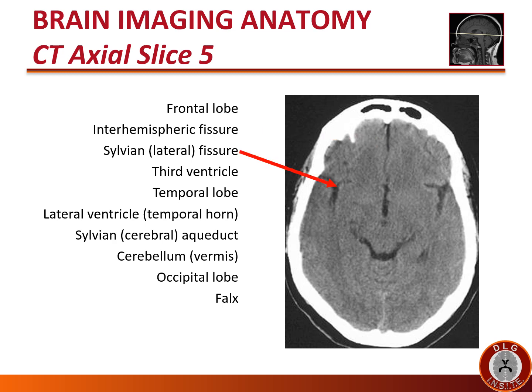At this level, the sylvian or lateral fissure has a different appearance. Notice it looks more like a T at this level, separating the temporal operculum from the insula and frontal lobe. At this level, you might see small, round, middle cerebral artery branches within the sylvian fissure.